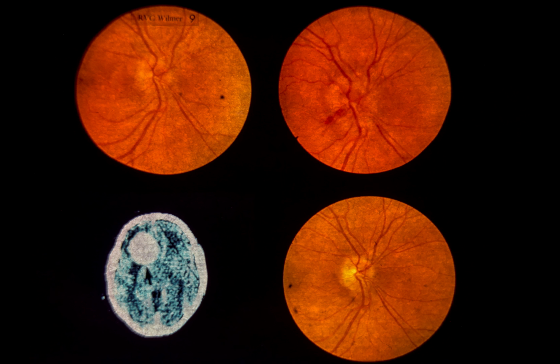Comparison of the upper left and the lower right photographs clarifies the findings in early optic disc edema. Typically, early disc edema is characterized by hyperemia, mild blurring of the peripapillary retinal nerve fiber layer, an indistinct margin, and slight dilatation of the retinal veins. Venous pulsations may be present or absent. Small, superficial, flame-shaped hemorrhages may be seen at the disc margin. Fluorescein angiography during the early stage of disc edema often, but not always, shows leakage from the disc capillaries.